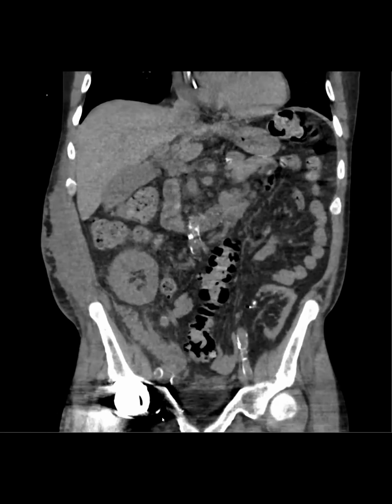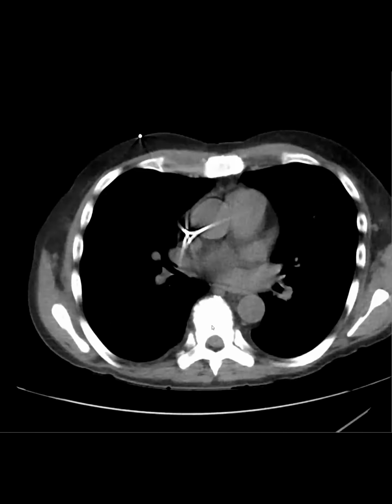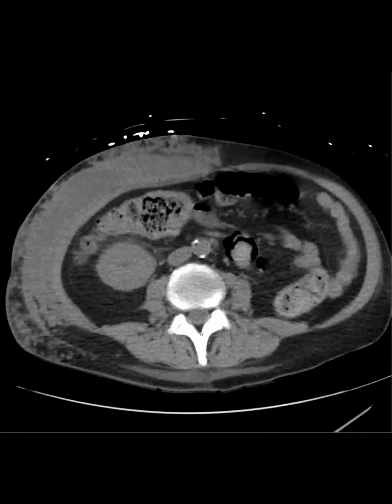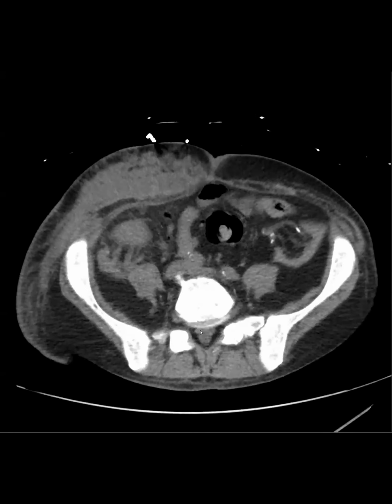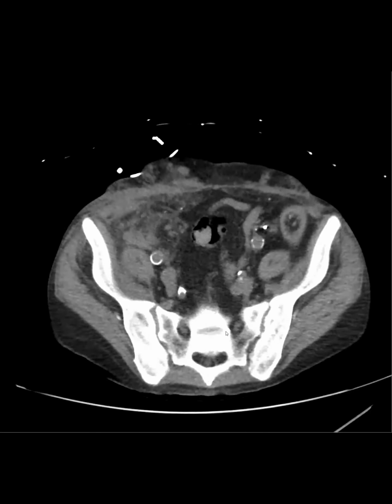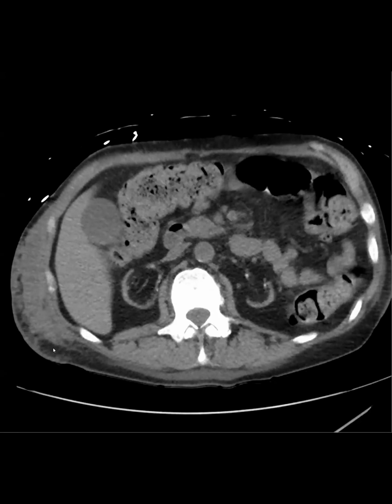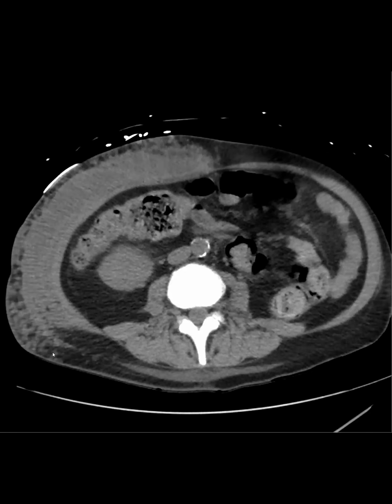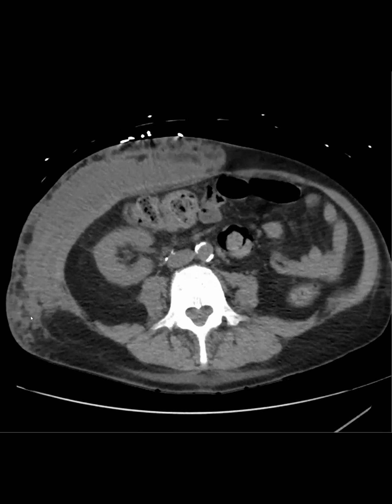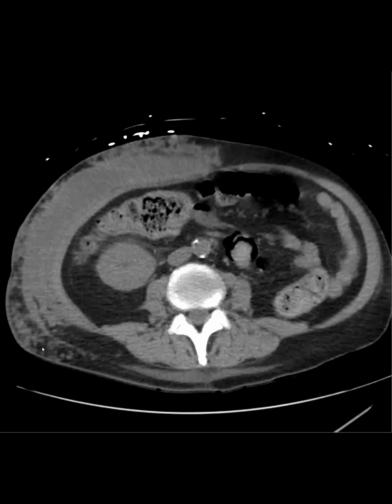So what else? Can you tie it all together? So basically, if you saw this nodularity in the peritoneum, the omentum, and I think retroperitoneum, you would think about pancreatitis involving the soft tissues, which would be so weird. So anyway, this is fat necrosis and saponification from pancreatitis.